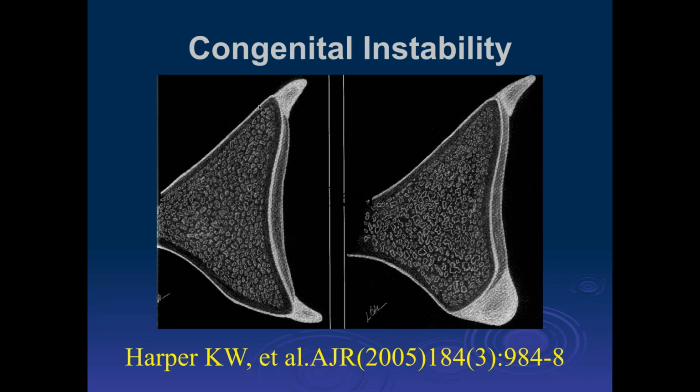So here we can see that this would be the normal glenoid, and it's usually a little bit more anteriorly anteverted. And this would be varying degrees of flattening of the posterior glenoid with enlargement of the labrum, which lead to congenital instability. And this doesn't show the retroversion that's usually associated with the anomaly on the right-hand side. So just like that last case.